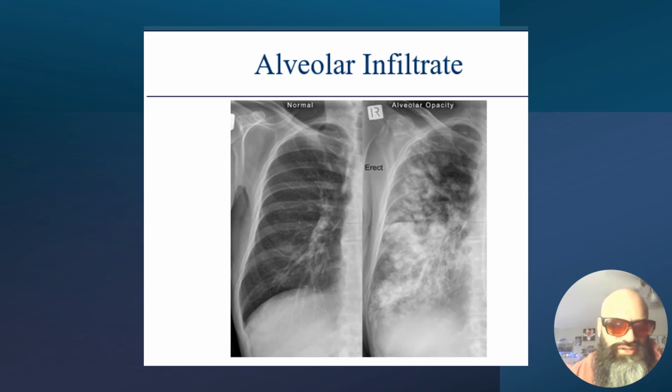Here's an example of what we are looking at between normal and abnormal. You have a normal X-ray. You can see the air density clearly indicated here. The pulmonary hilar vasculature here. Your costophrenic angle is sharp. You have your right hemidiaphragm. But when we compare it to this view here, we have multiple fluffy areas that are consistent with alveolar infiltrates.